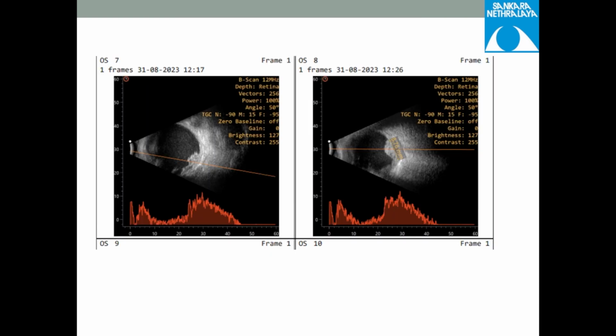What are these measurements and how do you take them? Transverse basal will be the longest diameter at the base of the lesion. What is lateral? What is anterior posterior? When you take the mass, what is important for us? Height is height. It's not anterior posterior. You want to describe a tumor. It is important for us to map the tumor and then we need to treat it.